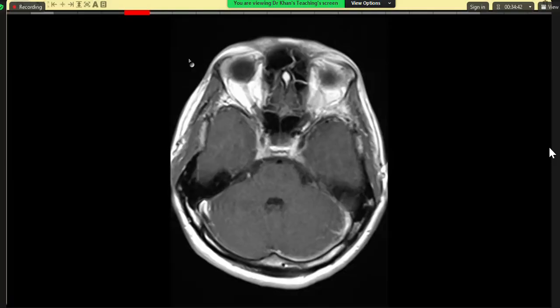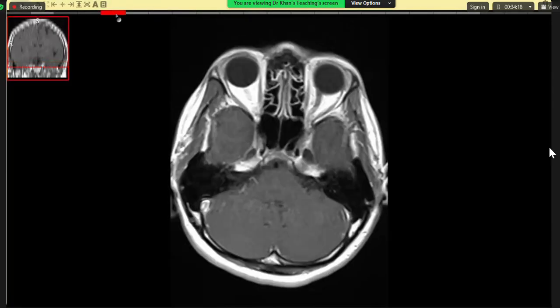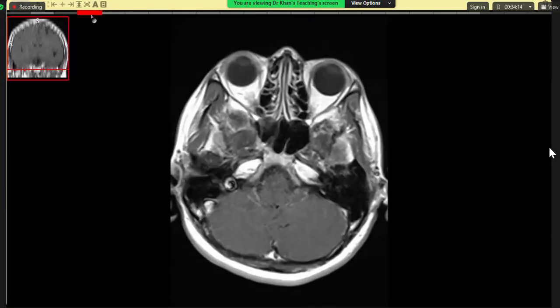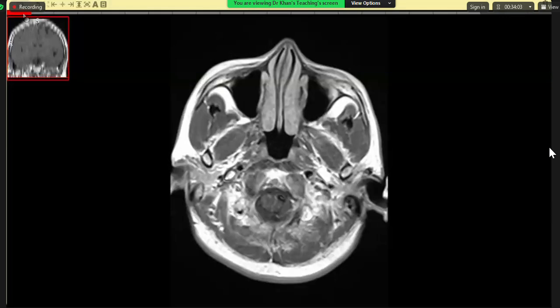I would advise clinical and lab correlation. And you have talked about sarcoidosis. What else can it be? I am asking you the differential. You have said meningitis, you have said sarcoidosis. I'm asking you what else can be in your differential. So, leptomeningeal carcinomatosis, but it shows diffuse nodular thickened enhancement and mass-like lesions, and the history should be known in that case. What will you advise next? Sir, I would advise clinical and lab correlation and CSF analysis of the patient to confirm my findings. Okay, thank you.